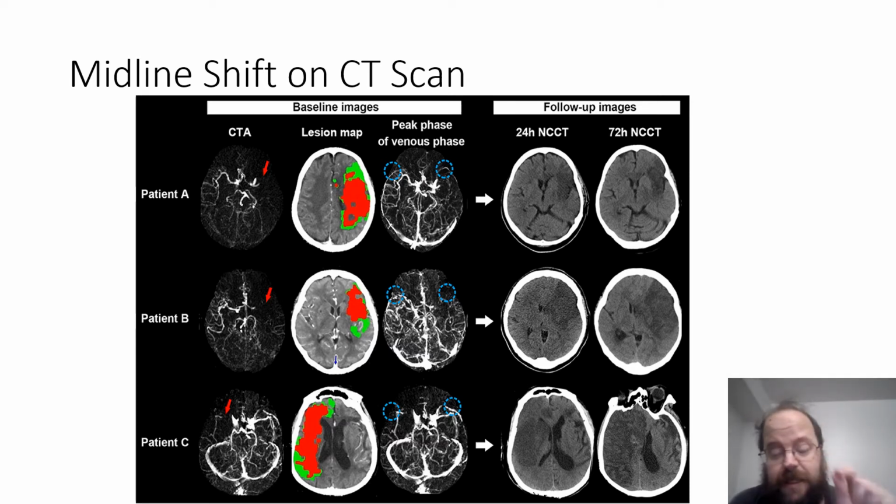So when they're talking about midline shift, what they mean is the entire cerebral hemisphere has been displaced to a side, left or right. And when you see that kind of shift, what it's telling you is that the entire hemisphere of that side is under high pressure, and it's likely to kill a lot of neurons, both deep inside the brain as well as on the cortex and the surface. So they're likely to suffer a lot of neurological symptoms in the long run.